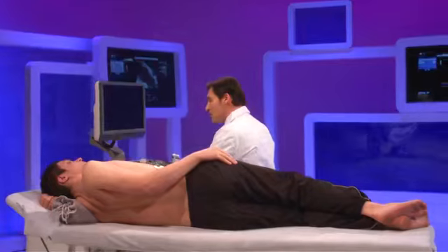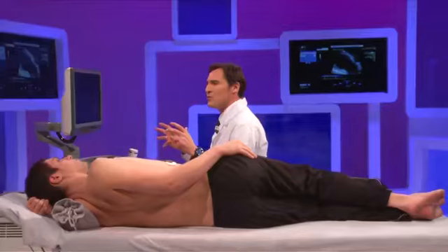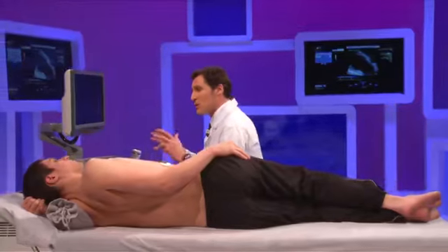When you want to assess a patient with degenerative mitral regurg, so primary mitral regurg, so intrinsic mitral leaflet disease, you need first to evaluate the morphology of the valve, which belongs to the qualitative assessment. You need to assess the semi-quantitative parameters, and in these parameters you have some of the parameters related to the severity of the mitral regurg. So quantify the mitral regurgitation.